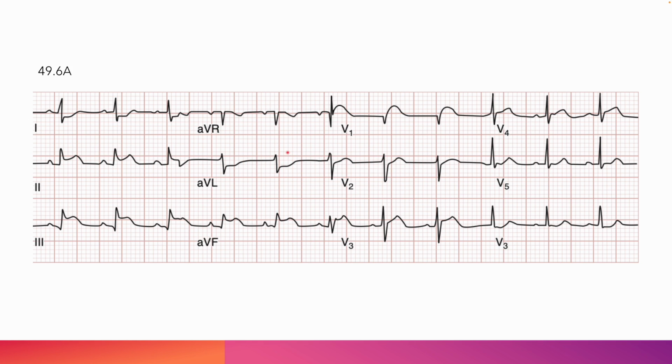Now this is another ECG, again leads 2, 3, and AVF. You check the lateral leads, and you can see that there is ST depression in AVL, lead 1, V5 and V6, not there, V6 is not apparent, so there is reciprocal change.